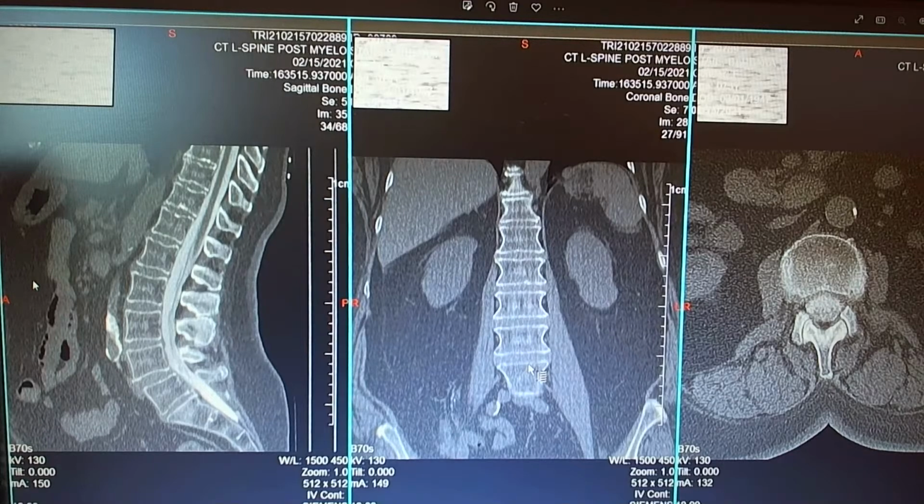If you see that the omentum has lots of globules of fat, and it goes between all the folds of the intestine, and when they move, it makes the movement there easier and better. And as well, it's fat. It's one of your areas where you accumulate fat for your metabolism. Sometimes too much. Like look at that here. There's a lot of omentum fat here.